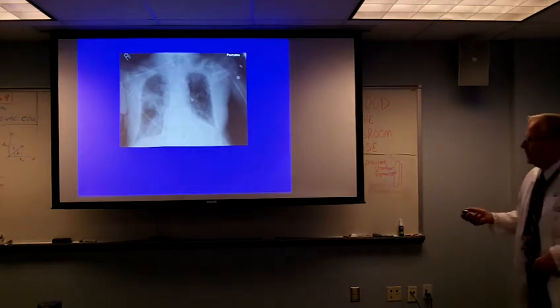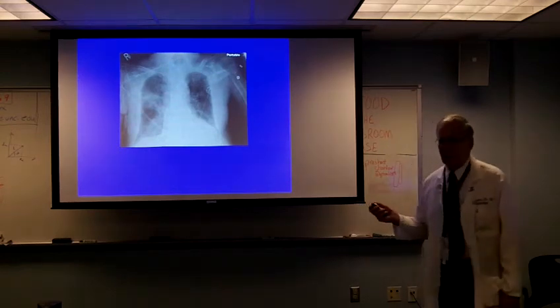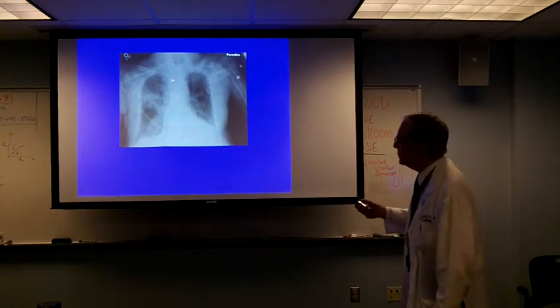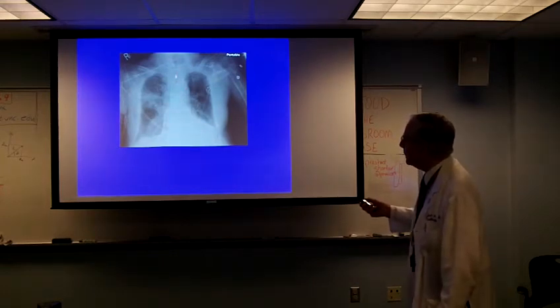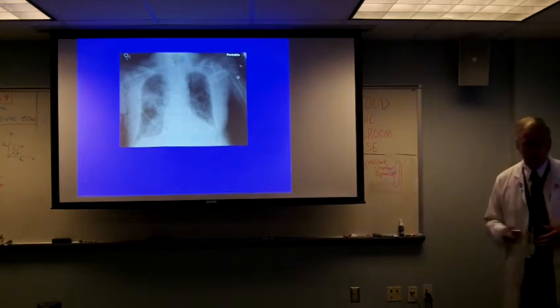This is the example I was going to show you earlier of the balloon on the endotracheal tube. That's way overdistended. Can you imagine what that's doing to the airway, which is this column of air here? Can you all appreciate the difference in magnitude? Yes.